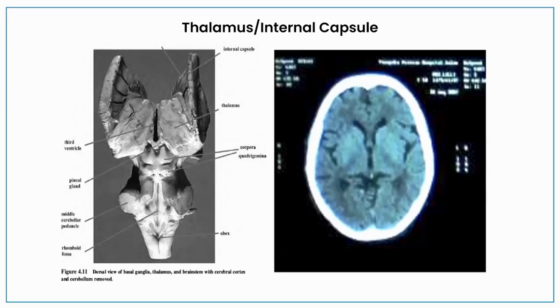Once you have passed through the brain stem, you can look at the image which I am showing here on the screen. Just pay close attention. So what is this image? It's the same picture which I showed some time back. This is an actual anatomical slice of that image. This constitutes your brain stem. You can see the middle cerebellar peduncles which are sliced in this image. So you have medulla, you have pons which is attached through these peduncles, and you have a midbrain here.